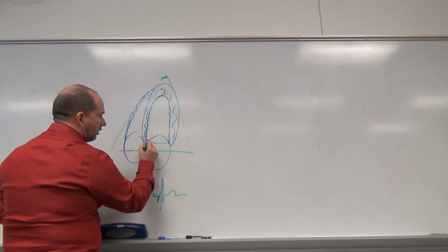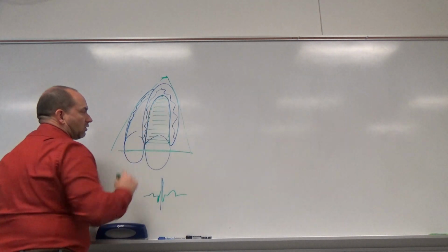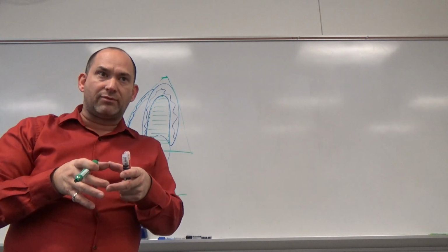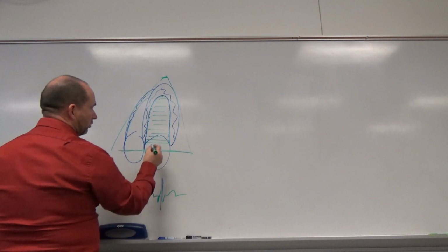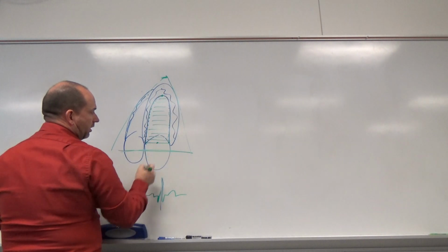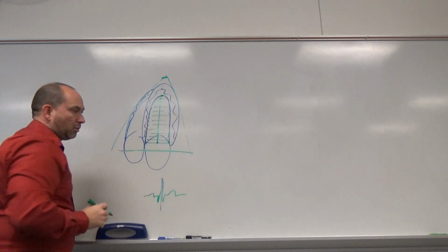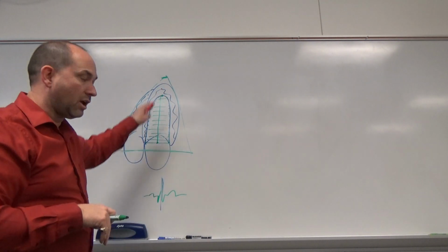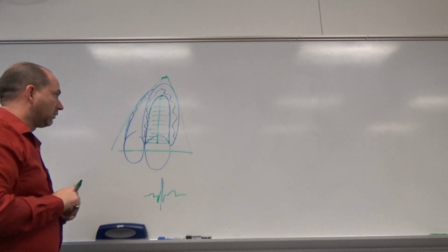What it does is it creates a whole bunch of little discs all the way through here. That is the system's way of calculating miniature cylindrical volumes and then adding them together to create a volume. The other important thing there is we've got the middle of that chamber to the middle of the annulus plane, and that maximum length is taken to create that volume. So we have an area length method to create a volume out of this.